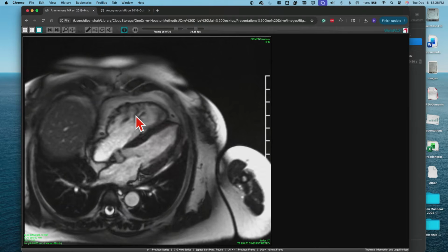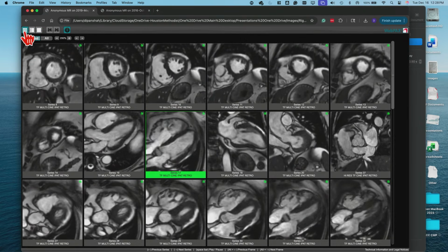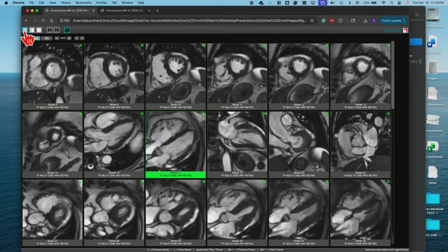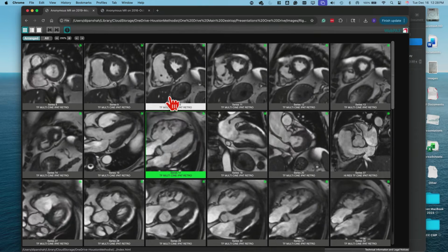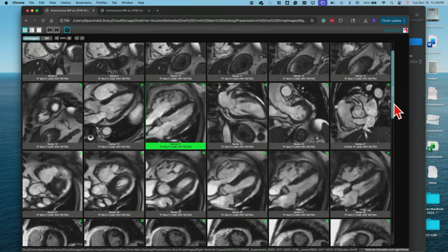There's irregular motion, right? And then, so already you say, okay, I've got some abnormality of the right ventricular contractility. I've got abnormality of the right ventricular thickness, where it's almost like an accordion, where there's increases and decreases in thickness. And then, importantly, don't just look at one or two views. Let's scour through all the views we have, and then we'll come back to this in a second.